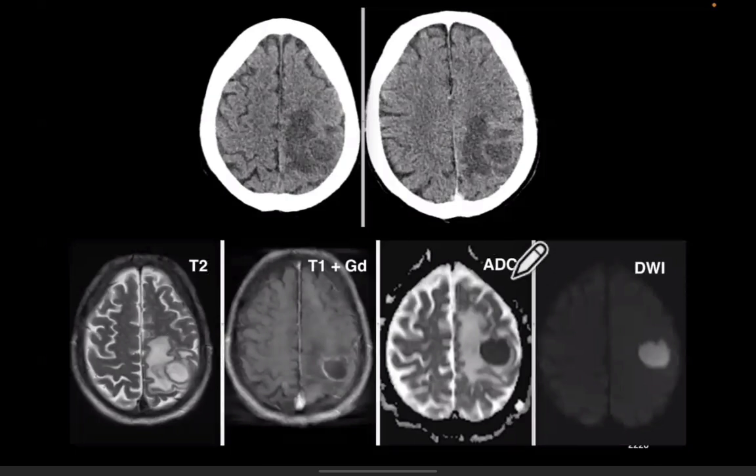So it's a great way of picking up a cerebral abscess. If anyone ever asks you what you would do for a cerebral abscess, well, always go clinically. If the patient's got a fever, they really need to start antibiotics. Clearly, the neurosurgeons need to get involved at an early stage. But you can do an MRI scan and do this DWI, and you get this restricted diffusion.